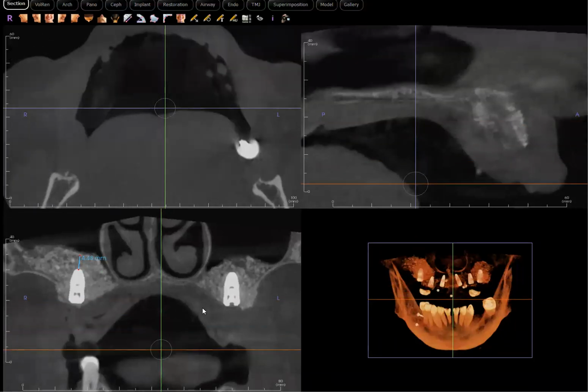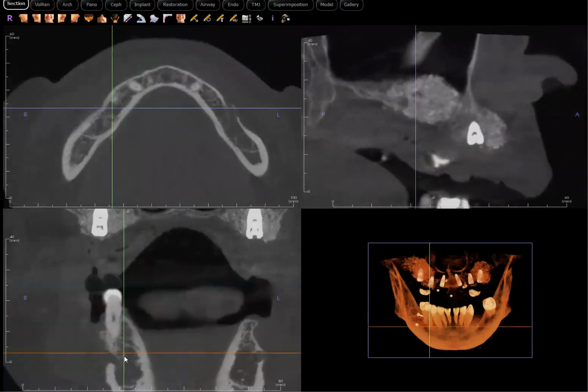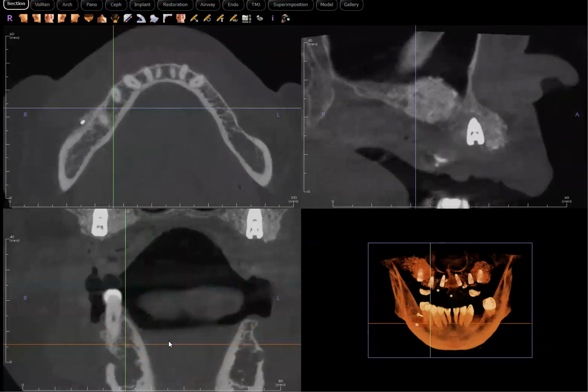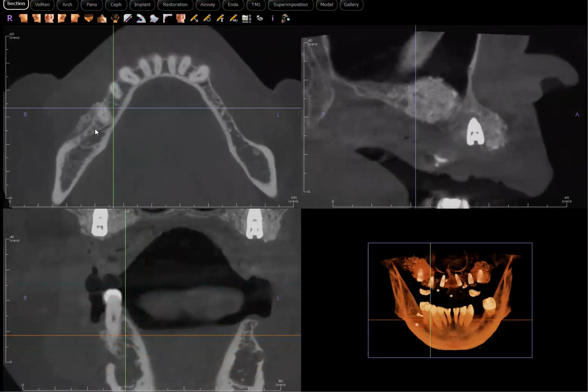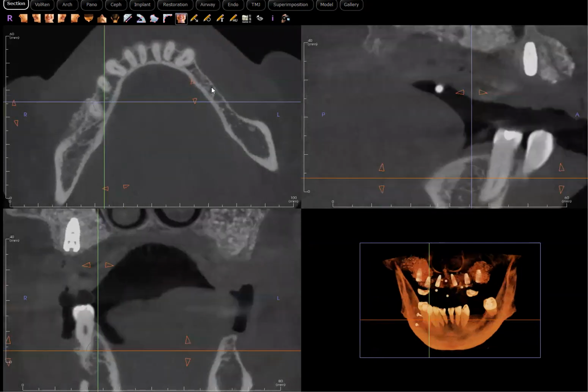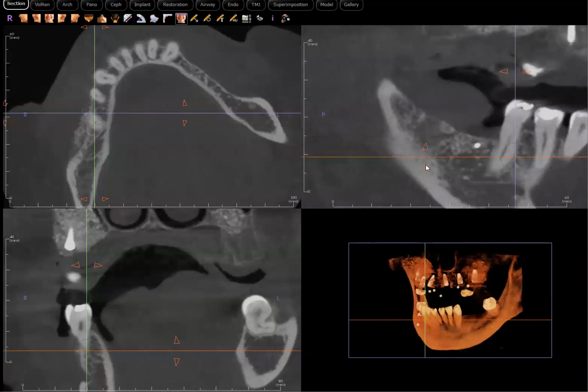this one, 3 months later, and let's see how much it has improved or remodeled since then. So again, where we have this implant, the screws represent the area of 30. And why don't we look at area of 31 first? Because that was very clear that the socket had not been remodeled.